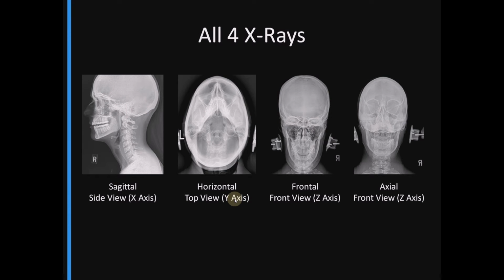Now you will have your axial X-ray information and be ready to transpose that axial circle curvature to your frontal film. And that concludes our axial X-ray analysis.